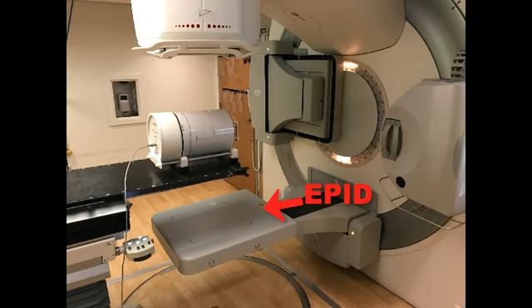There are some challenges to this because turning that image into a dose is complex. You have to correct for scatter, you have to correct for energy response in the detector, and other effects. So it's a bit of a work in progress still, but this is one direction things are going, and the advantage is that you have a very high resolution image. The EPID is sort of similar to film in its resolution.